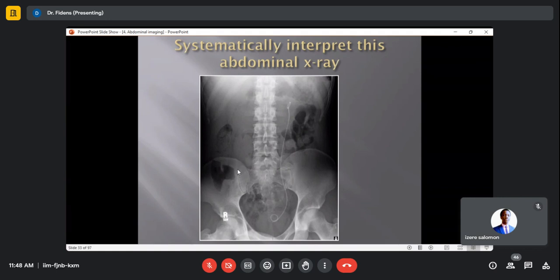This is a line. Listen, the line is continuous like this one. Okay, it's good to notice that, but this is a continuous line like this, and there's no fracture here. But it's good to see that. It's good to think about that. As a radiologist, you see many, but you accept few.